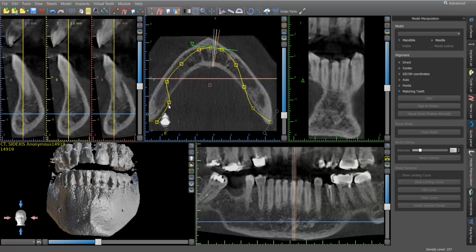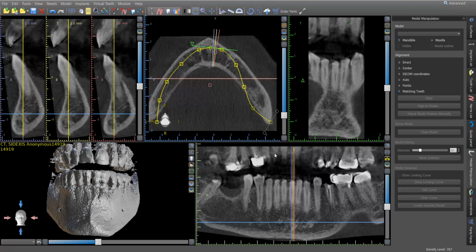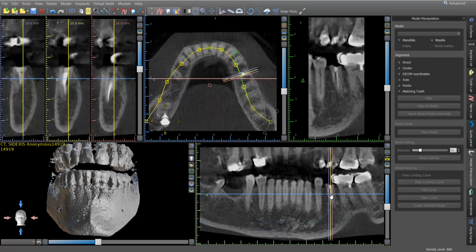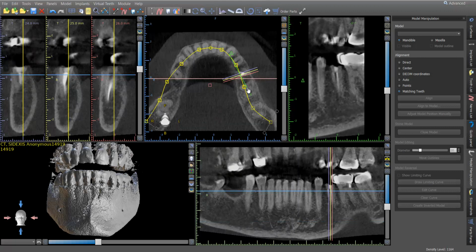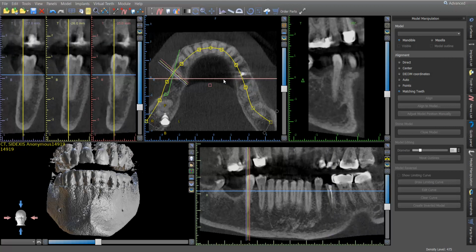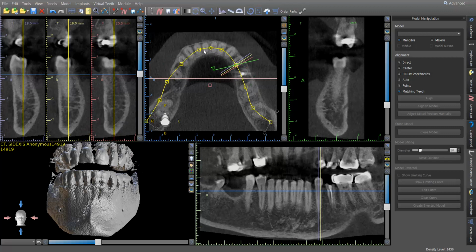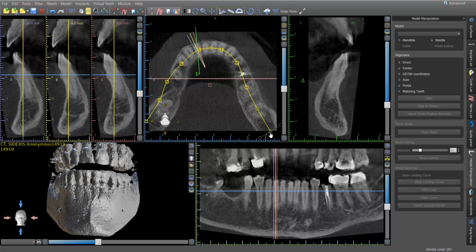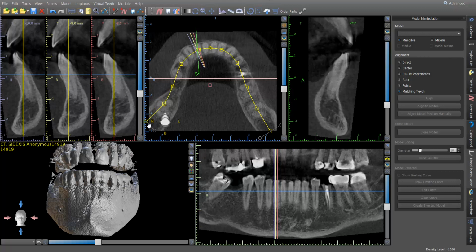And the first thing we're going to do is we're going to refine this DICOM to make it more easily viewed and tracked. First thing I do notice is this node right here, I refer to each of these little spots as nodes, is a little bit out of whack. And ideally, this is the tooth we're going to place an implant on. I'm going to click on this tooth, make sure I'm centered here, and try to bring my curve so that it centers me right through the tooth. If you ever find that you're trying to move and you're accidentally grabbing the lines instead, just click somewhere else for a moment. Okay. Now these spots do not affect the actual guide output, they're just for help visualizing, so you can place them wherever you want. There is no way you can screw this up. This is just a chance to make the navigation a little bit easier on you.